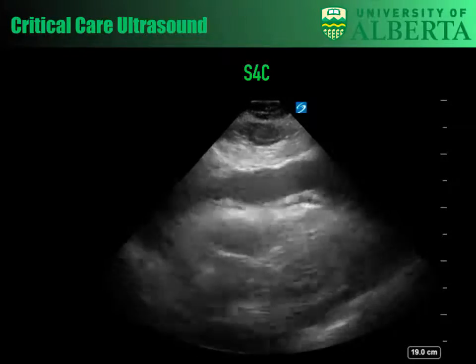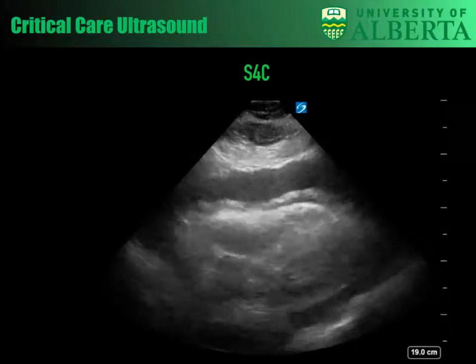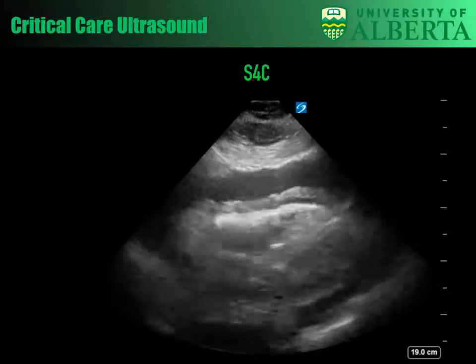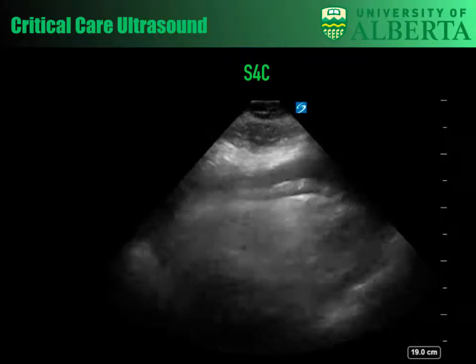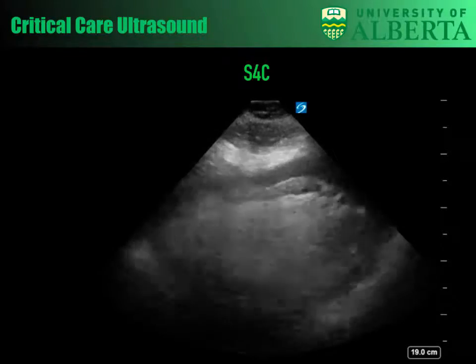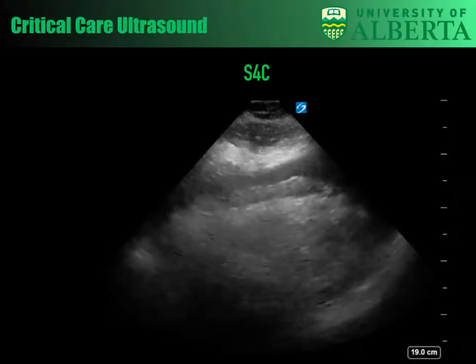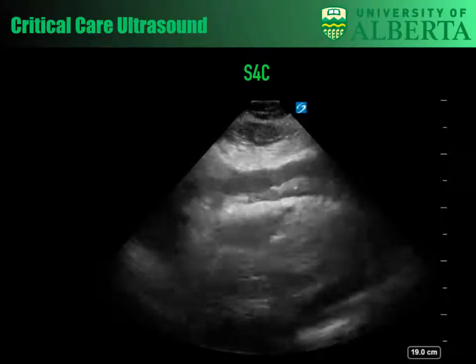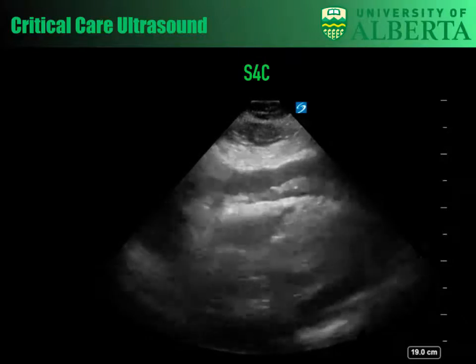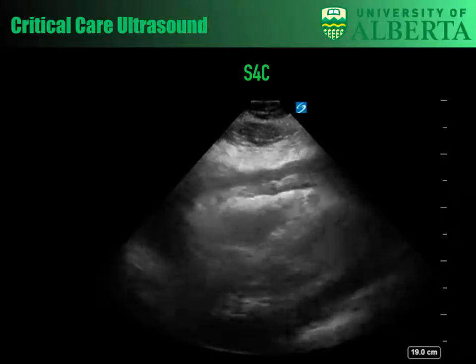I'm always cautious: if I can't see something very well, then I say I just can't see it very well, right? Because you can't. The RV itself, if you timed it, you might say it could just be collapsing with systole, and that's what it should be doing. So it's hard to say based on this image alone if she's still in tamponade, and I would have my doubts. The RV is not demonstrating a significant amount of collapse, and it's pretty open there. But again, it's the clinical circumstance. If you took away that 6 liters of fluid and put this patient on propofol, you can bet your dollar they'd be in tamponade, because that would decrease their preload and change their balance with their intrapericardial pressures enough to cause tamponade.